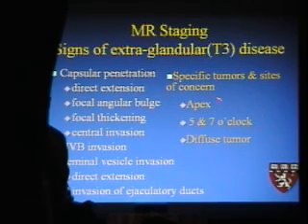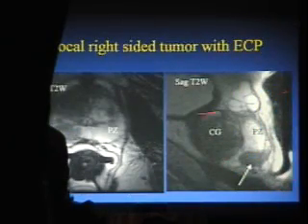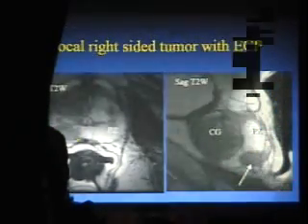Tumors that bother us are ones that are down deep at the apex. Remember, this is an inverted pyramid. The apex is towards the feet. The 5 and 7 o'clock locations are diffuse tumors. You've seen this case a minute ago. This is now a better view of it.